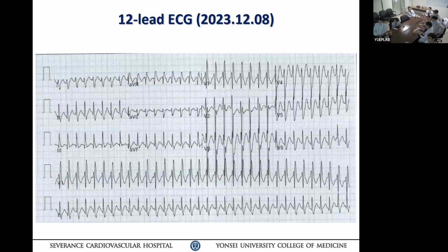답을 되게 많이 보냈어요. 일단 설명해 준 대로 와이드 QRS 타키카디아 소견을 보이고 있고, V1에서 RBBB 패턴으로 보이고, 제가 봤을 때 V1 쪽에서 RSR' 트리페이지로 보이고, 그리고 V6 쪽에서는 RS 레이쇼가 R 쪽이 더 큰 쪽으로 있어서 이런 점은 좀 SVT 쪽을 페이버 생각을 합니다.